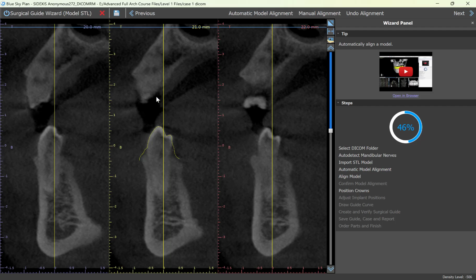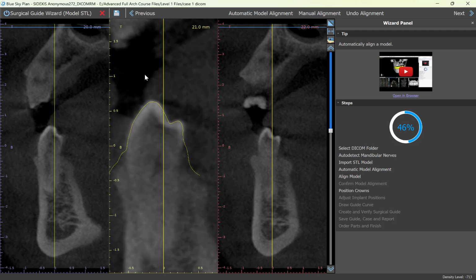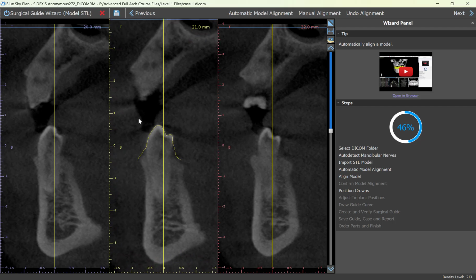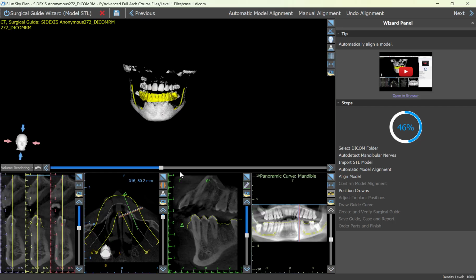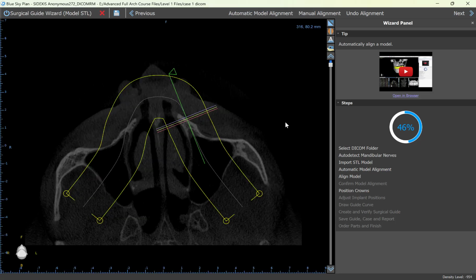And then you probably won't have to use this a ton, especially in a routine case, but if you hold down the right mouse button and push forward, again, that gets your zoom. And so you can zoom in, zoom out. So that's basically going to be the same functions in all of these windows.